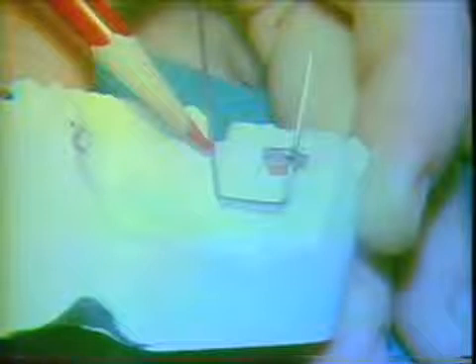This slide demonstrates the folded back portion of the lingual arch in the lingual sheath, and the right angle bends along the lingual surface of the model, and the bend position marked with a red pencil. This shows the right angle bend and the plier position.